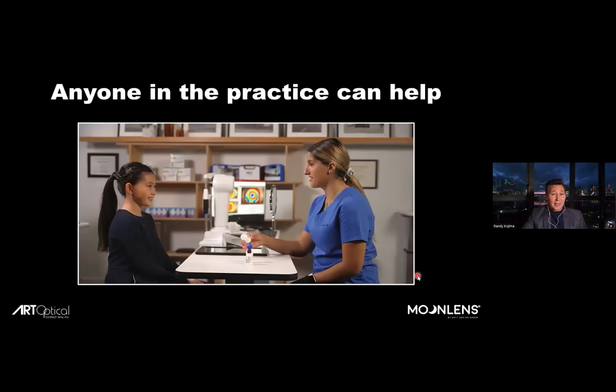Now, as you can imagine, because so much of this is using software and not you sitting down in front of a slide rule and calculating out each individual parameter, this is something your technician can do, and you don't have to be involved in the entire process.